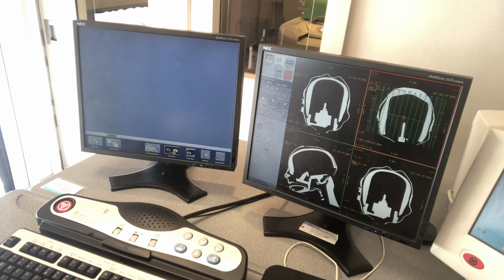And you'll hit OK. So now you hit exit, because we've done our coronal and sagittals, and it comes up and asks, do you want to quit? Autosave is checked, and hit OK.